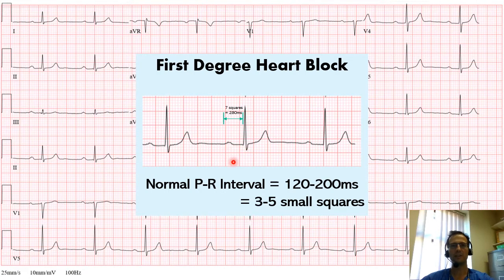So this is first degree heart block. And in itself, it's not necessarily of concern. You might want to think about investigating the patient for more bradyarrhythmias, but only if there were symptoms pointing in that direction. In isolation, this doesn't really need any further consideration.